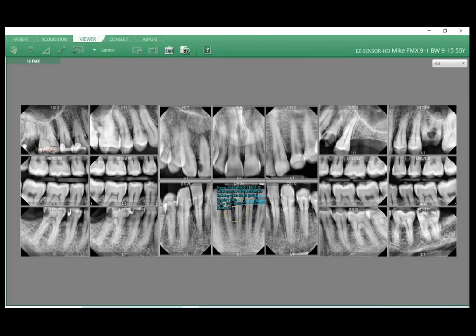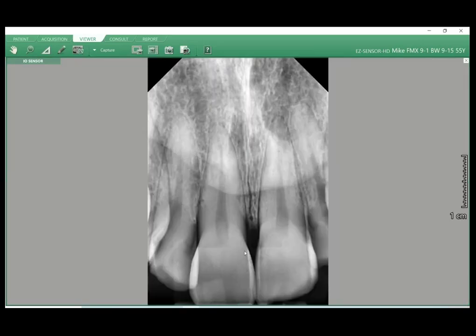I do have one comment coming in. One office wants to know, is there a way to list the images at the bottom of the view frame to be able to select through them one at a time? And then the next question is, I see the all button up in the upper right hand corner. What is that drop down there, and how do I go back 6 months to look at my set of images there? Right. Okay. So let me go back to that.